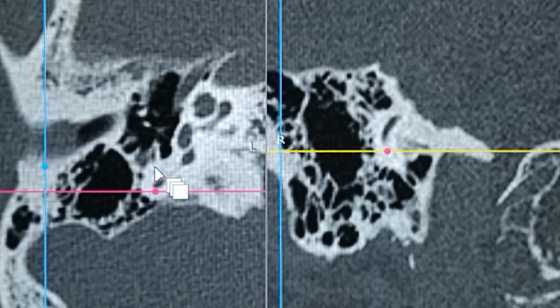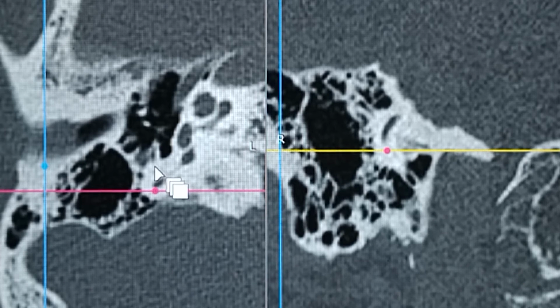The second one is the auricular nerve of the facial nerve, which gives off sensory supply to the posterior part of the auricle, somewhat like that. Third is the chorda tympani nerve. The chorda tympani is the third branch of the facial nerve going in the vertical facial segment. So this is the pyramidal eminence, the stapedius tendon, the muscle, and the superstructure of the stapes.